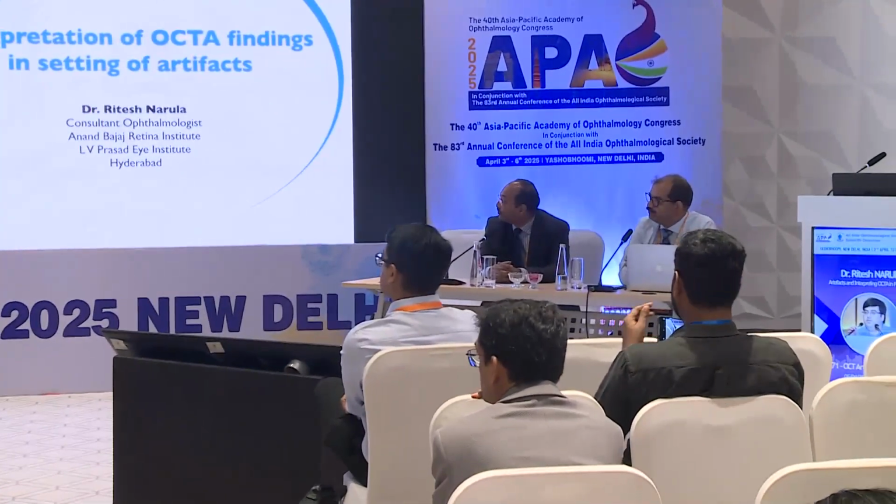With this, we'll go on to our next talk, which is very important. Ritesh will be talking about artifacts. I have mentioned in my talks about artifacts, what are the problems with artifacts, and Ritesh will be highlighting, because these were the normal OCTA pictures, but if you have a lot of changes in the retina, the contour becomes different, and then you get a lot of artifacts. So you should be able to interpret what are the artifacts in the retina and how to diagnose these diseases in presence of artifacts.